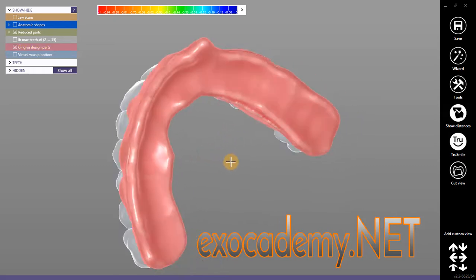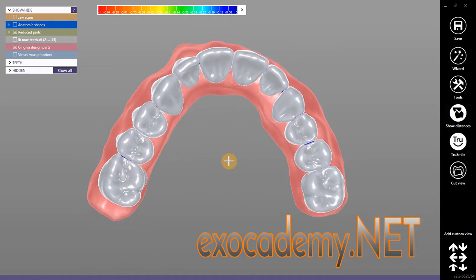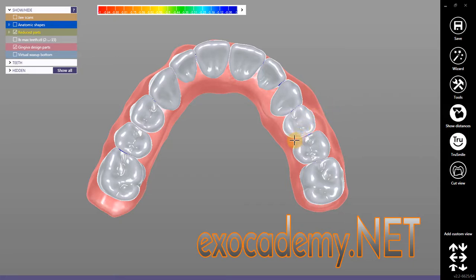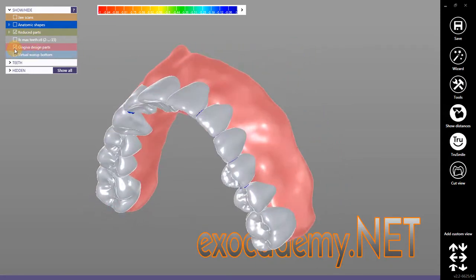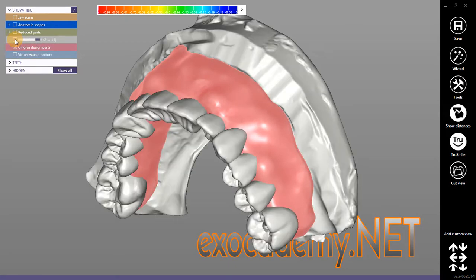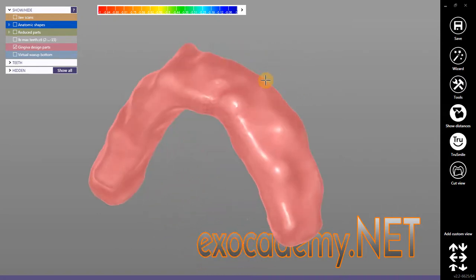So how do we get that surface, that wax up bottom surface, to approximate the bar or the jaw scan? And the way that we do that is by entering our expert mode, going down to the bottom and finishing the job. Even though we can see the teeth and the gingiva in the spaces that we would like, they aren't cut out. You can see here when I remove the teeth, the sockets aren't taken out of the gums, and the bar, as we just showed you, is not going to be able to fit on that PMMA tissue surface.